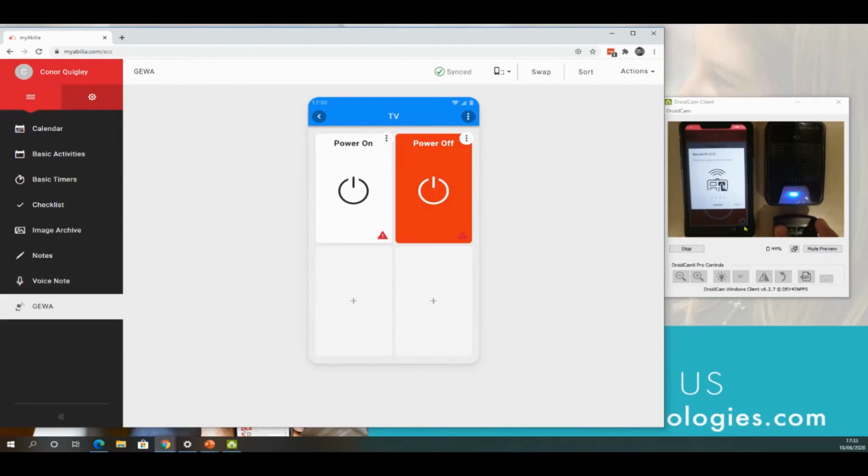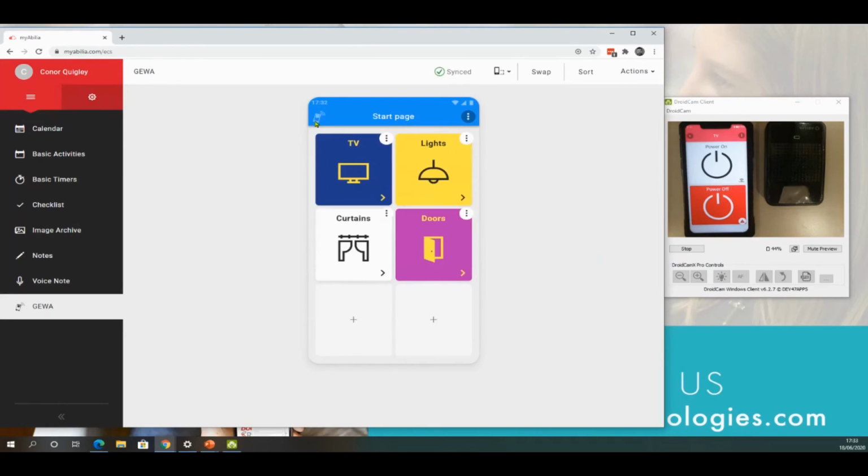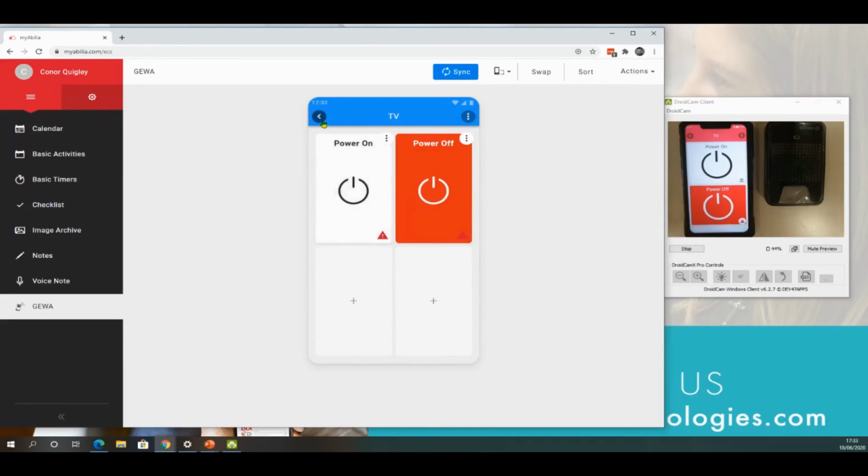And now a third time. And now that's done. Now that is synced into the system, and we can just click next. We only want to send the signal next, and next again we'll do it for, and so on. So if we go back out, we can see the red icon has turned to a little black icon, and we can start to use the system on it.